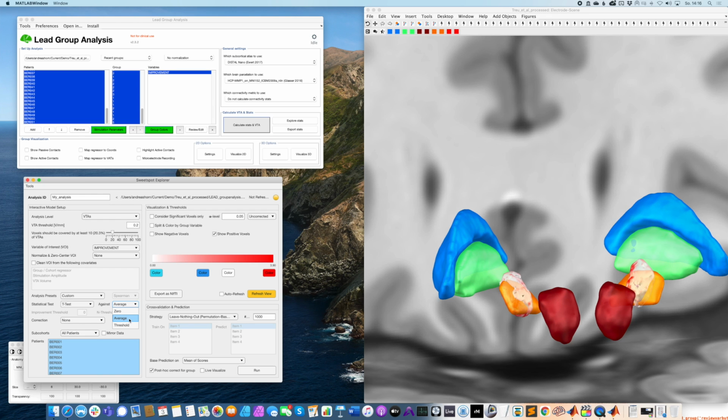And there are more details that you could set. Again, read up the Dembeck paper about the details on that. Finally, you could correct the improvement variable against certain regressors such as amplitude or VTA size. That is pretty similar to cleaning the variable above here, but a slightly different strategy.